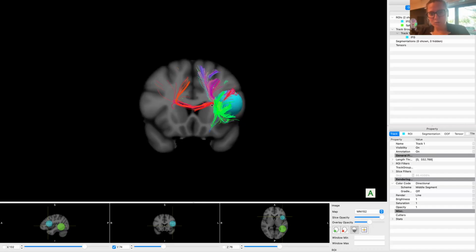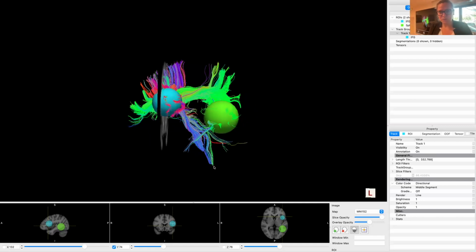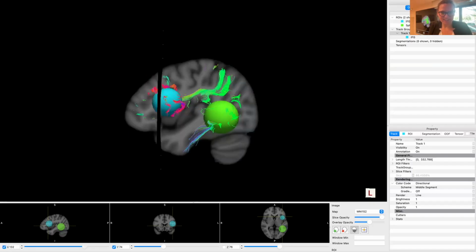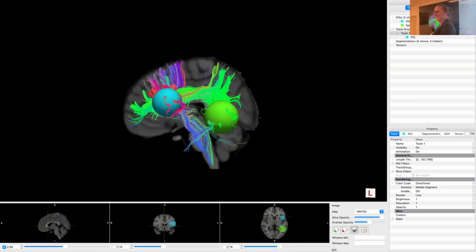So we're picking up the callosal fibers, and then we're also picking up, what's this one here? Let me give you a brain reference again. That seems to do the trick. Now, which one? Pyramidal tract, yeah. Corticospinal tract, generally speaking. Okay, we're going down this one.